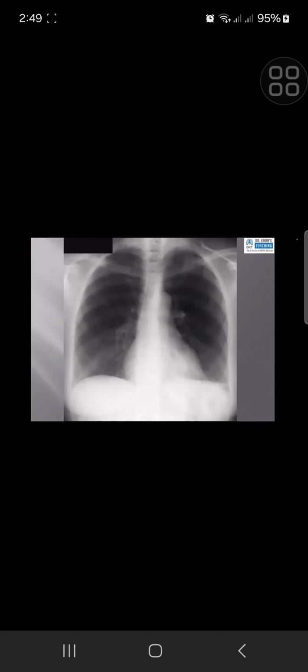So I am presented with a frontal radiograph of the chest. There is a flattening of the left hemidiaphragm, and I can appreciate an opacity in the left retrocardiac region. This is likely within the lungs, as it is mostly well circumscribed posterior to the heart, with slight silhouetting of the descending aorta, suggesting that it might be in the left lower lobe.